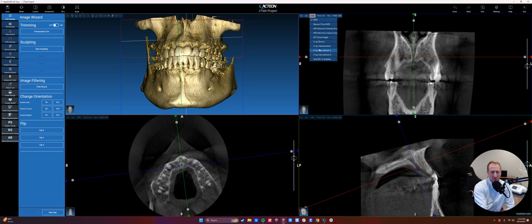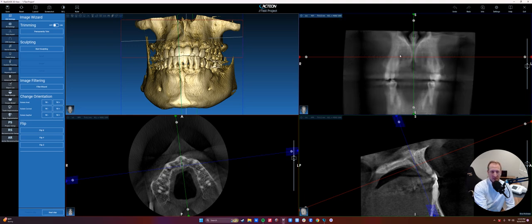MPR and all these different ways of looking at slices, and this will come into more effect when we talk about our CPR curve or our panoramic reconstruction. But if you play around with those, you might see that it might make things a little bit more visible. But generally for this scout plane view, you want to keep things in MPR, which is the single slice thickness. We can change the thickness of each slice. So this is 0.2, that's in our extended volume, that's the size of our voxel, right? So each slice is 0.2 millimeters thick, and that's the easiest for reading for pathology. If you wanted to change that, this is more useful for panoramics, but you can change the thickness of each slice if you so chose.